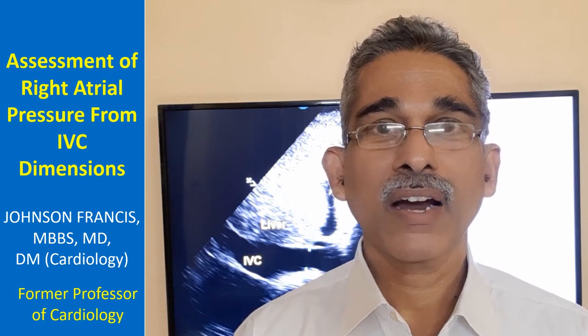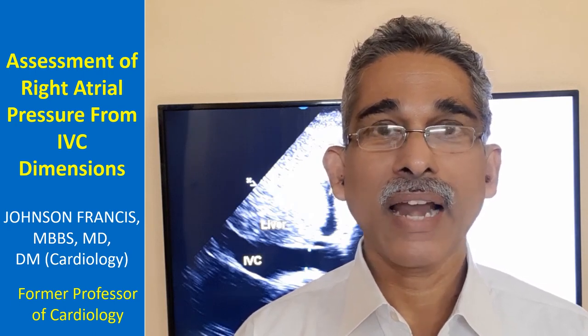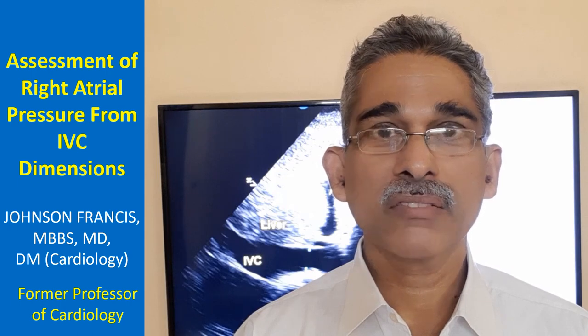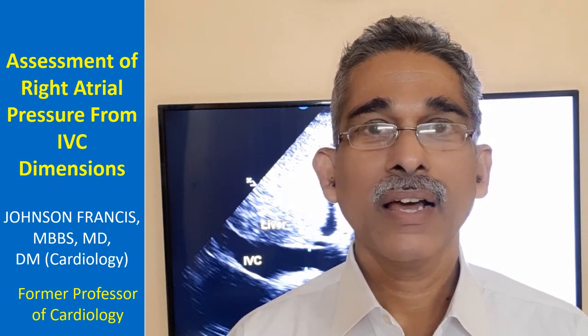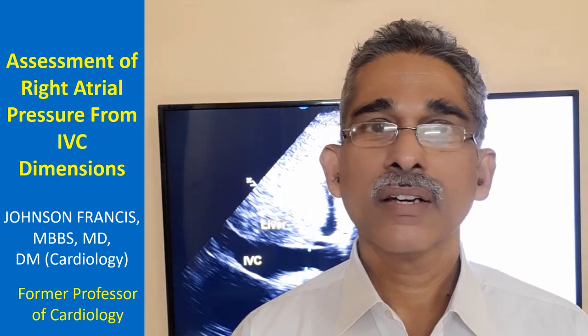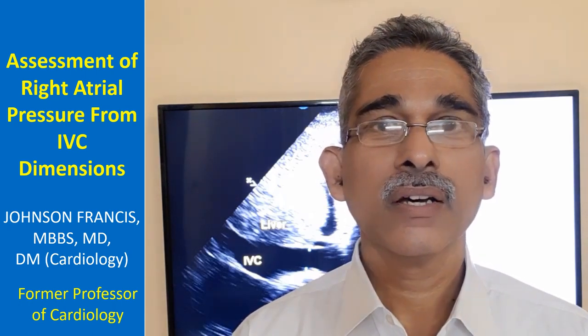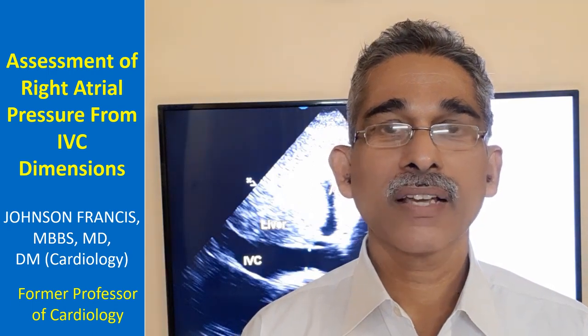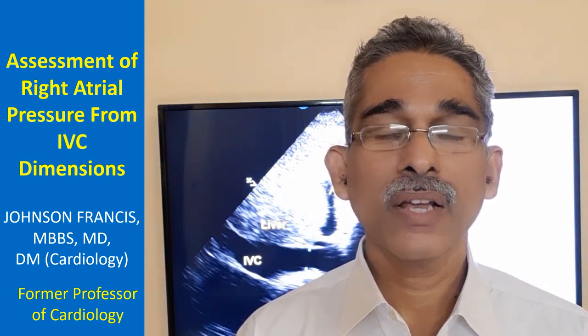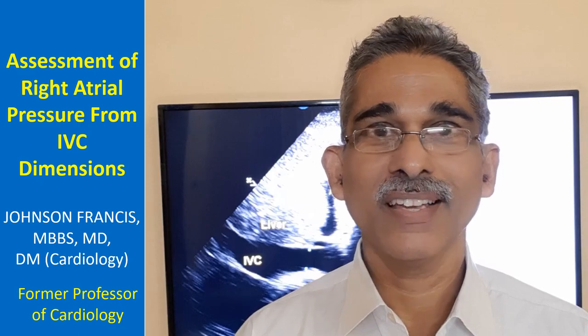On the other hand, when the IVC is enlarged or rather plethoric, then you know right atrial pressure is high, and even if there is hypotension, you cannot give much fluid to such a case. So this is the importance of assessing IVC, which we will see in a little more detail.